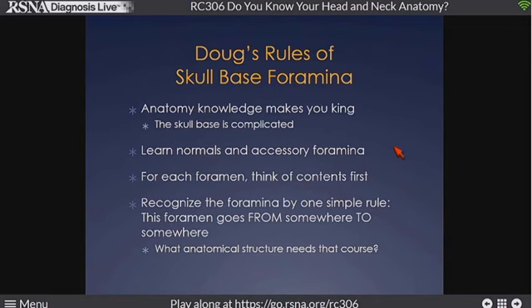So we're looking at these little holes in the skull base. Realize as a radiologist, your knowledge of anatomy makes you king. People come to you with questions about things because they know you're all over this stuff. Learn the normals and the accessory foramina, and every time you look at a skull base CT or a cervical spine CT, it's a chance to look at those foramina and just hammer them into your heads. When I approach that and I'm thinking about the foramen, I think of the contents first. And then when I know the contents of that foramen, I'm already kind of 90% there.